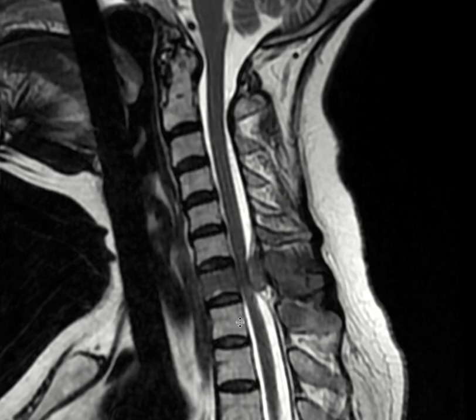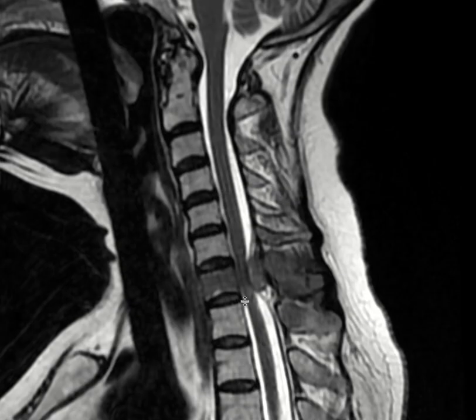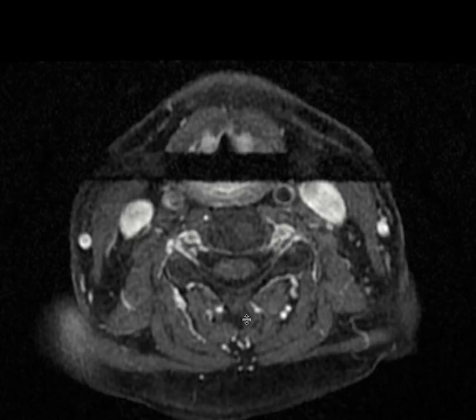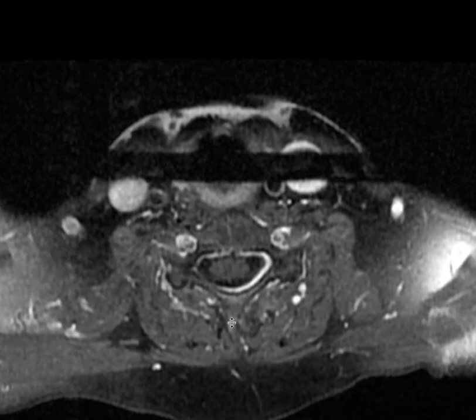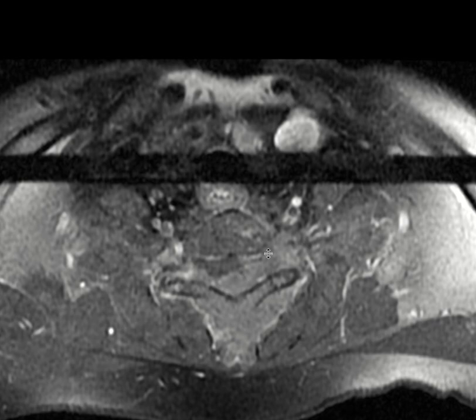They have to go and resolve this, or they do radiation as quickly as possible in order to release this cord compression. And then when we look at the actual sequence, we look for foraminal involvement. So when they do radiation, they should make sure they include all these in the radiation field of view in order to decrease the recurrence rate. So we see the left C6-C7 and C7-T1 neuroforamen is also involved with all this tumor, and these are all the tumor involvement that we saw in the sagittal sequence.